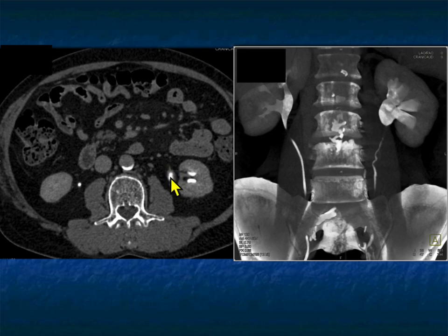Do you worry about this left ureter? Is that partial averaging? When you look at the reconstructions, you see that there's a dilated renal pelvis on the left. Maybe it's a UPJ. What's going on here and what's going on here? Well, the ureters do have peristalsis, and so it's hard to get the ureters routinely filled, even if they're a little obstructed. This actually is normal ureter, and this one actually is due to tumor infiltration.